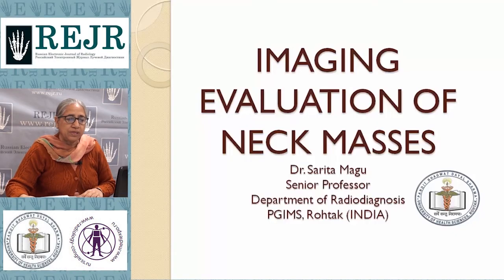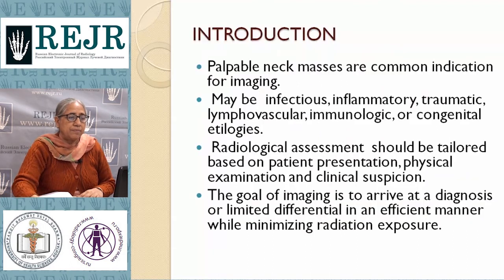I will be talking on imaging evaluation of neck masses. Palpable neck masses are a common indication for imaging. They may be infectious, inflammatory, traumatic, lymphovascular, immunologic or congenital etiologies. Radiological assessment should be tailored based on patient presentation, physical examination and clinical suspicion.